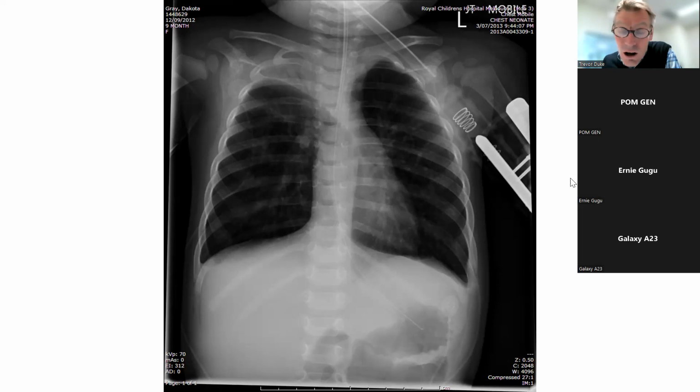Asthma. Okay, asthma. That's more because of over-distension, isn't it? Gas trapping. But what's the condition where you have reduced blood flow to the lungs? Yeah, pulmonary. Okay. So we've thought about when you see black lung fields like this, we've thought about gas trapping and over-distension.